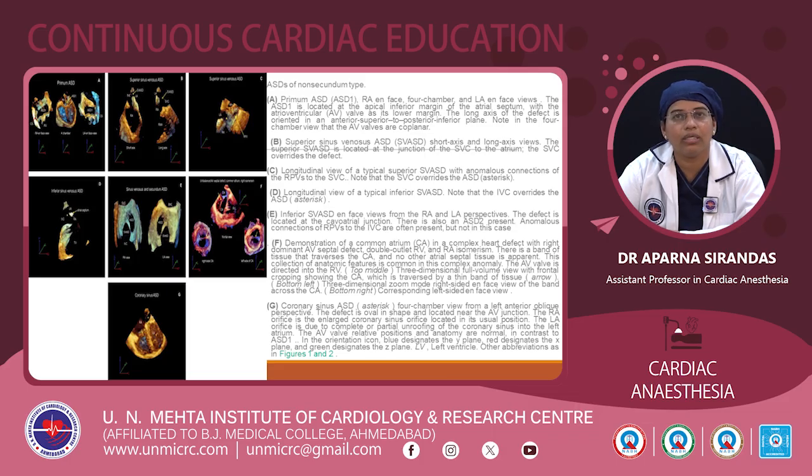And the G is a coronary sinus ASD, four chambered view with a left anterior oblique perspective. The defect is oval in shape and located near the AV junction. RA orifice is an enlarged coronary sinus orifice located in its usual position, and LA orifice is due to complete or partial unroofing of the coronary sinus into the left atrium. AV valve relative positions and anatomy are normal in contrast to ASD.